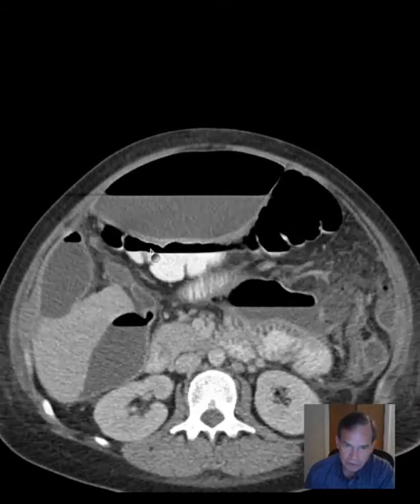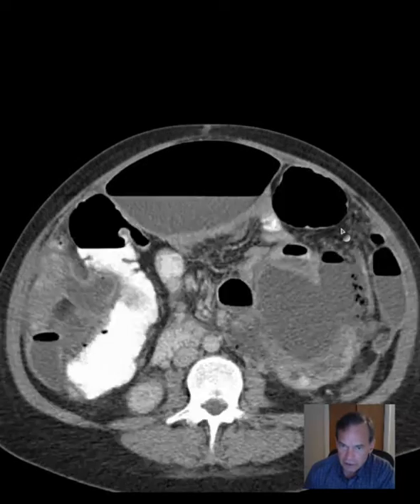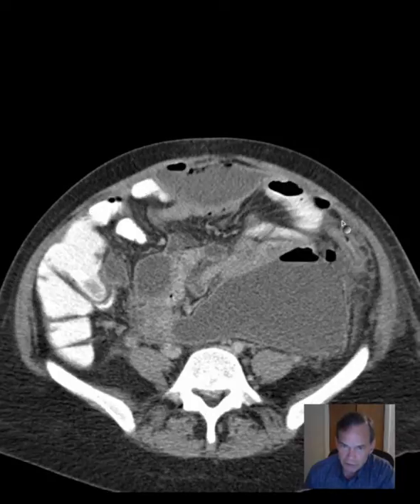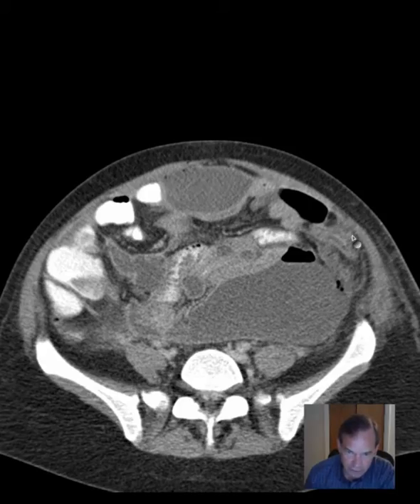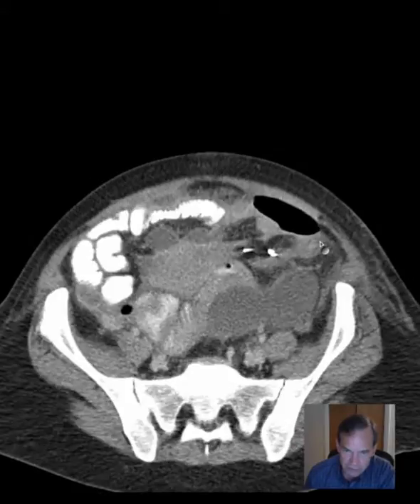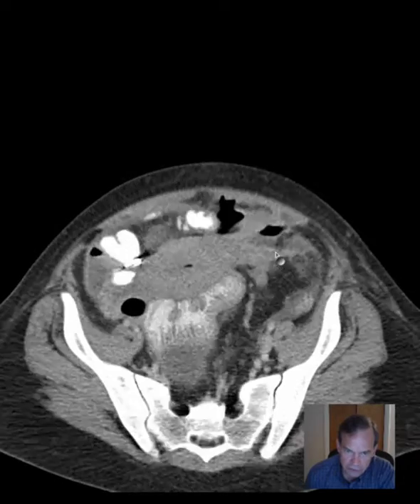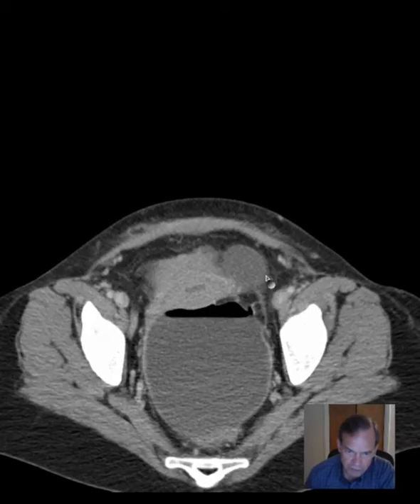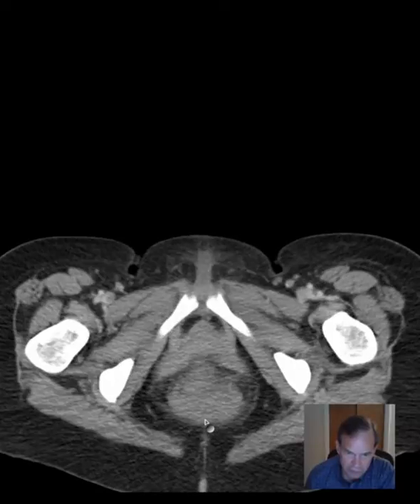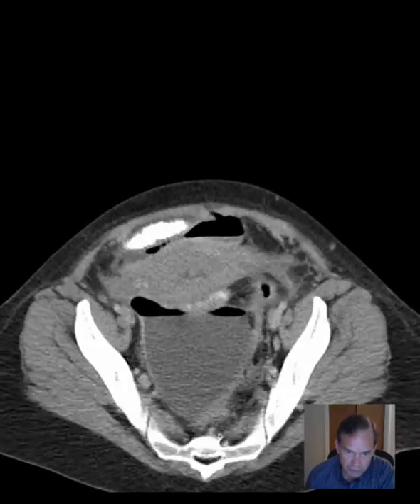Here we have transverse colon coursing over like that. And we follow that down now, and we see left colon, although it's hard to see that here. I think it's right in here, perhaps. Kind of lose it there. But if we go from the bottom up, let's see what we can find there. Here's the rectum. Follow that up.